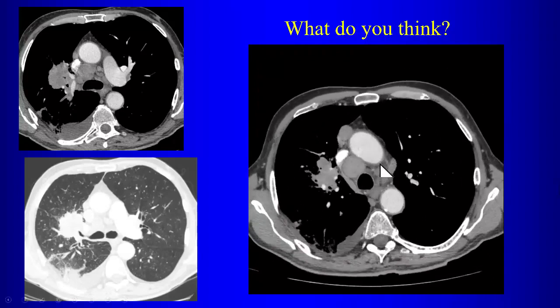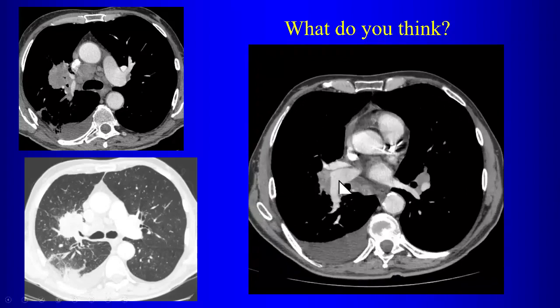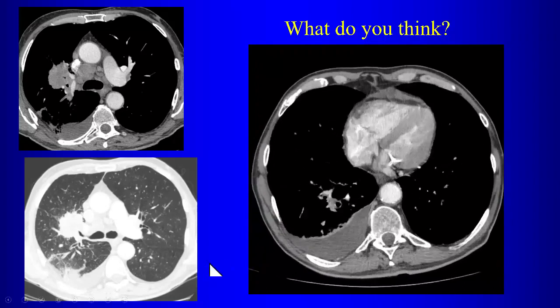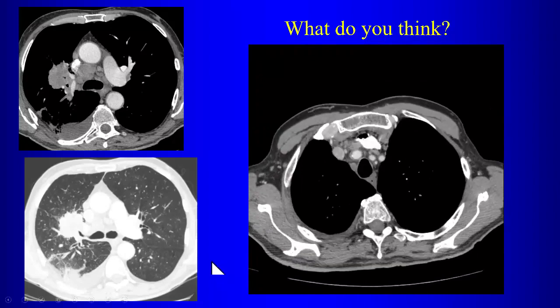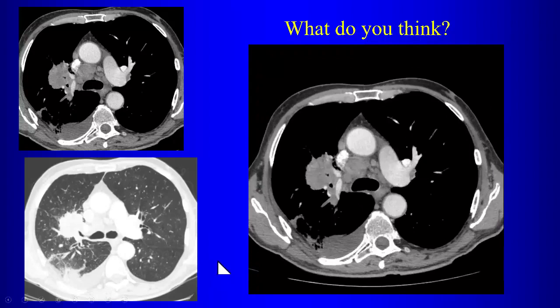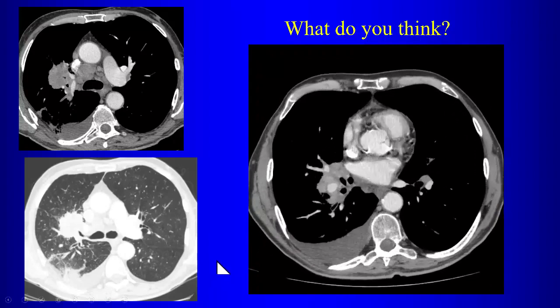Yeah. So this is not a PE scan, right? This is a routine CT chest protocol with contrast. There are clots. You can see filling defects there in the segmental pulmonary arteries. This is the most common scenario where you will see so-called asymptomatic pulmonary emboli in an outpatient. It's a patient with a history of cancer. So in all patients, they're hypercoagulable.